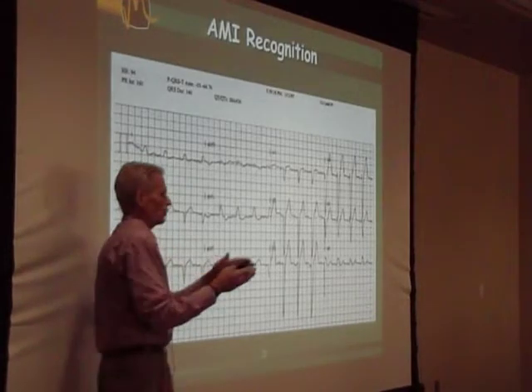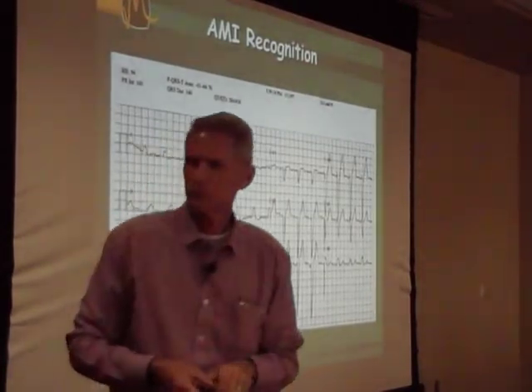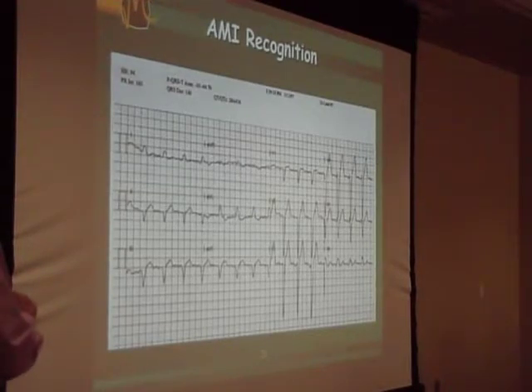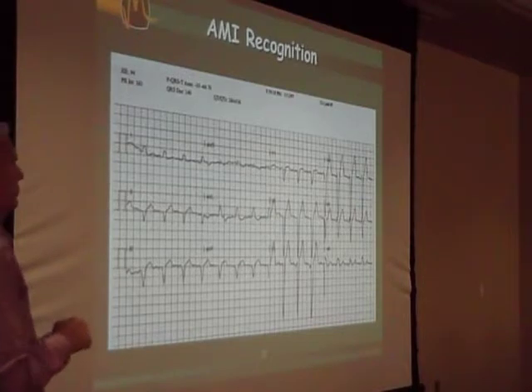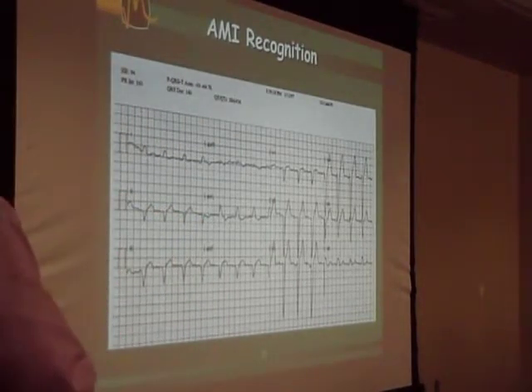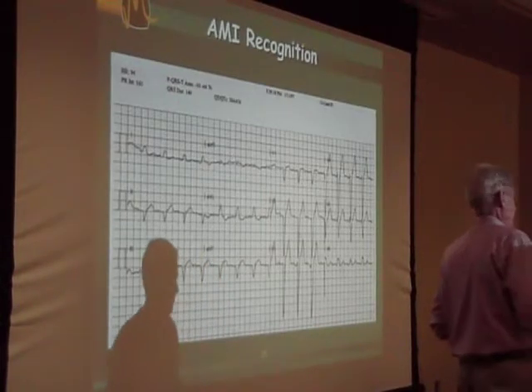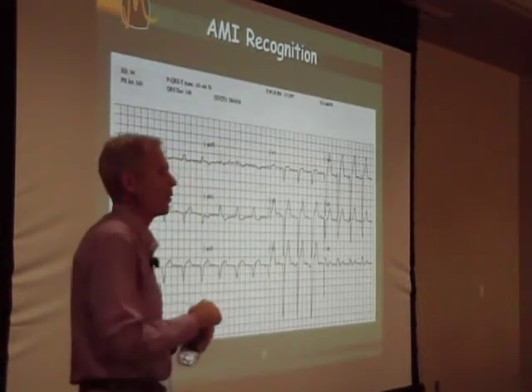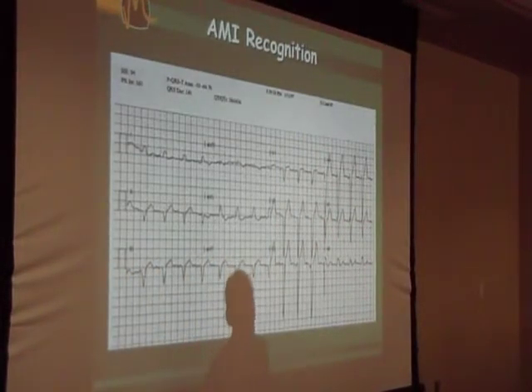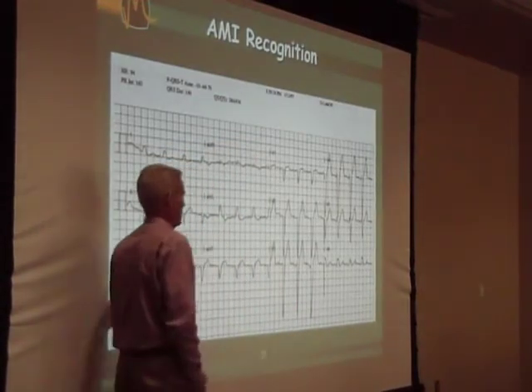So as we get to the end of this module, and I know you guys are ready for a break, and we'll give you one, I want you to look at the EKG on page 25. Call comes into 911, heart-related issue. Dispatch goes out. Let's imagine for a moment that we have the ability, every one of us, to pile into the back of one truck. We all show up at the scene. We go into the patient's house. We do a 12 lead. This is what comes spitting out. We pass it around for everyone to look at.